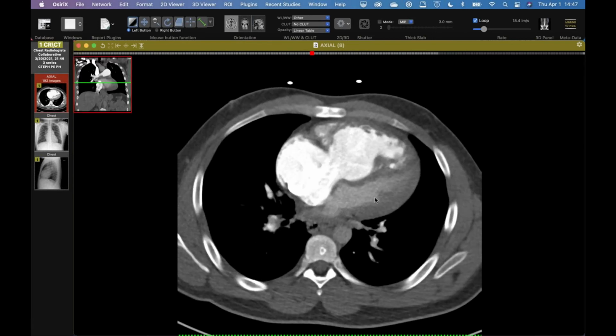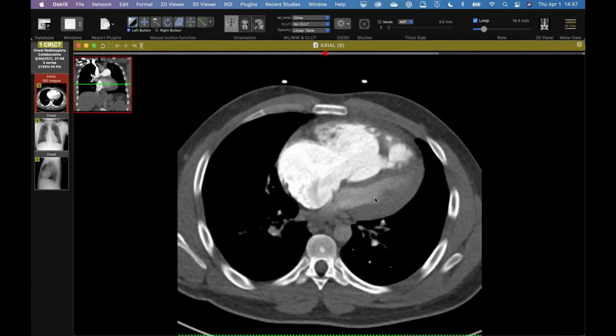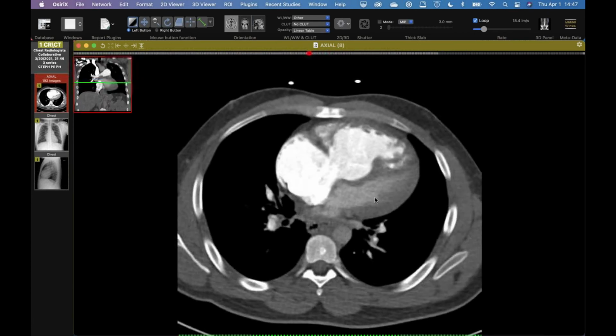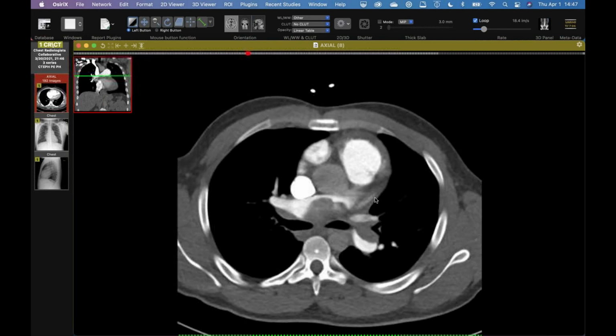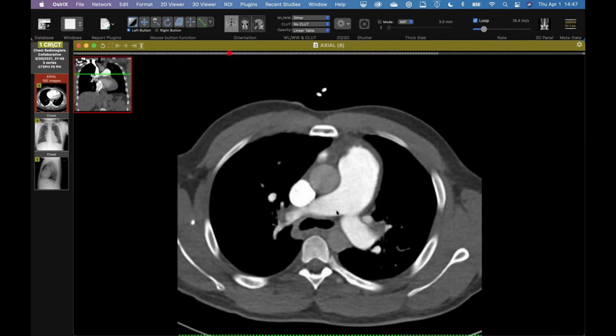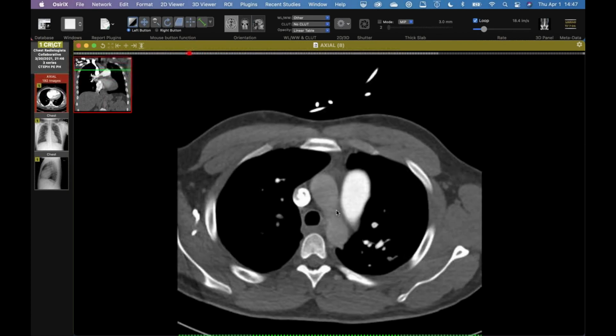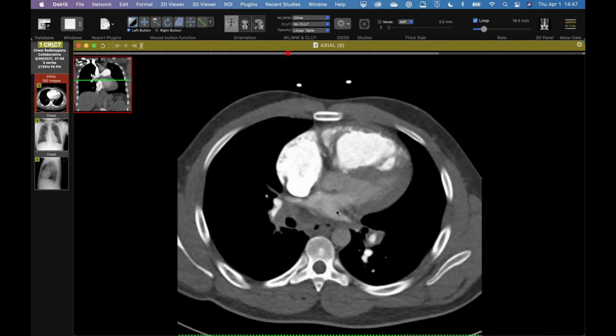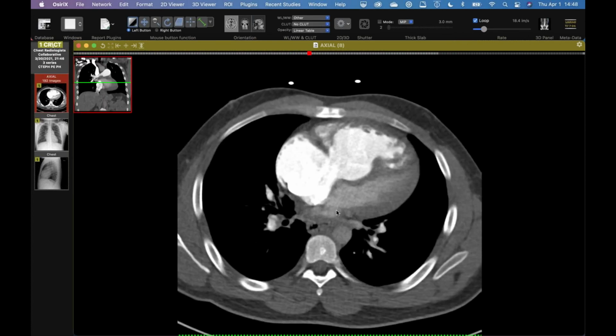He's got all this remodeling. He doesn't have an ASD or any other cause for PH, and it's really severe. So I don't know what kind of treatment options there are. I think this would be a tough endarterectomy. And of course, we usually send our outpatients to Seth Center, so it's going to be a little hard with this guy. But I don't know if anyone has any comments on this one.